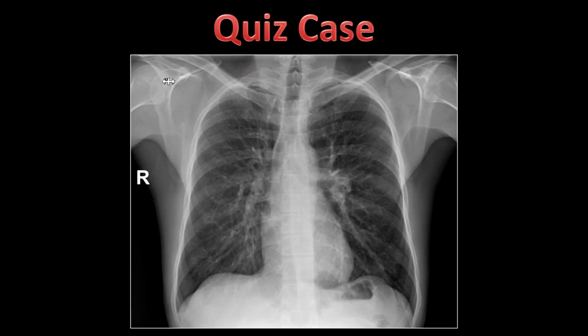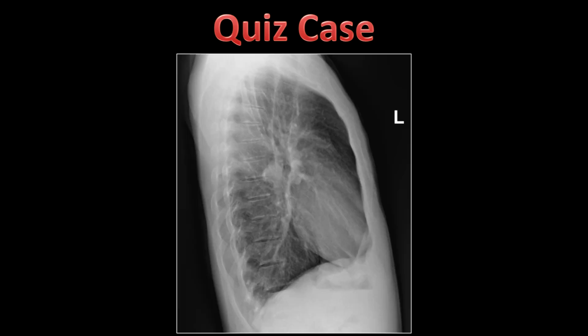Welcome to another tips and tricks case. Have a look at this chest radiograph and see if you catch any abnormalities. Here's a lateral chest x-ray on the same patient.